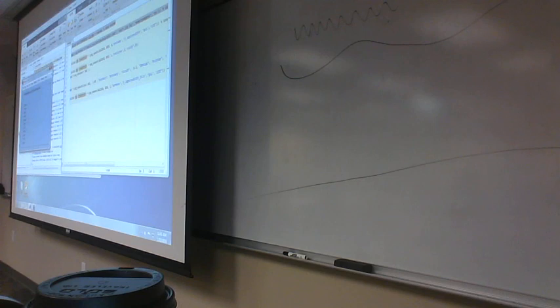Okay. So we recorded at 1056 hertz. All right, so an incredibly high frequency. We don't really need it that high. It keeps our file sizes massive, which is one of the reasons it takes so long for it to think. Okay, we want to downsample it. We're going to bring it down to 256 hertz. It's going to make it a much more manageable size.